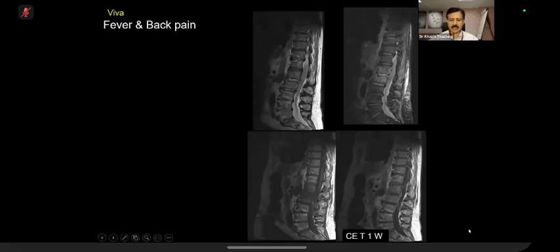What is happening here where I am pointing out? I'm looking specifically for an epidural collection. I can see there is evidence of an enhancing epidural collection on the post-contrast images anterior to the spinal canal. So the clinician says, "Can you drain it for me?" This collection is located anterior to the spinal canal. Now we're at the level below the conus.